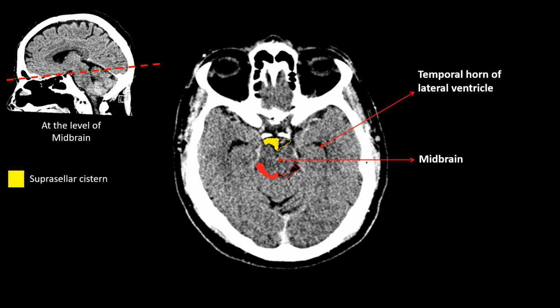The quadrigeminal cistern, also known as superior cistern or cistern of the great cerebral vein, is located between the colliculi, the splenium of the corpus callosum, and the superior surface of the cerebellum and extends from the third ventricle to the great cerebral vein.